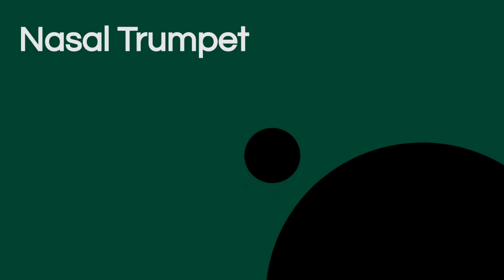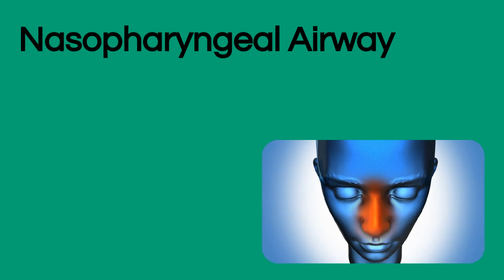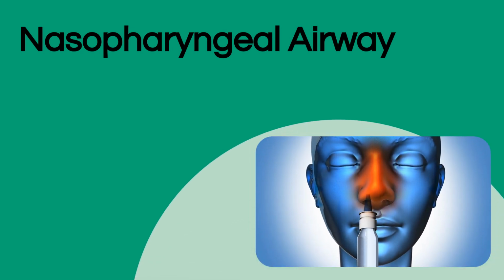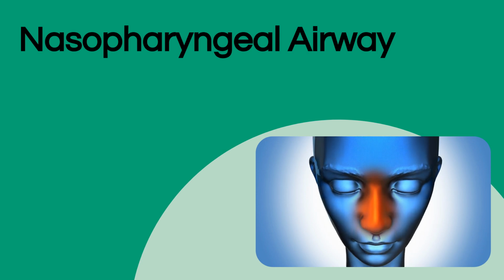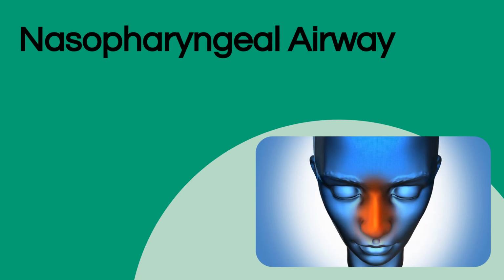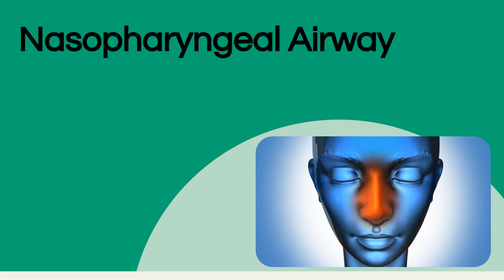Moving on to the nasopharyngeal airway, commonly called a nasal trumpet. This airway extends from the nose to the pharynx and is better tolerated in conscious patients with intact reflexes. Remember to lubricate it and insert with the bevel facing the septum. Risks include nosebleeds. Now we address the laryngoscope, essential for viewing the larynx during advanced airway procedures like intubation.